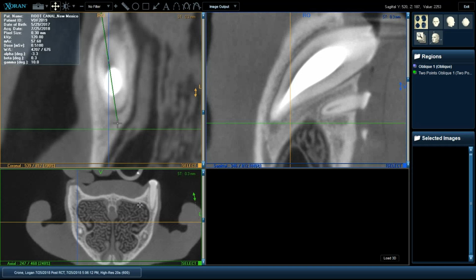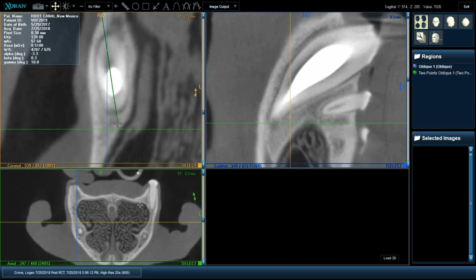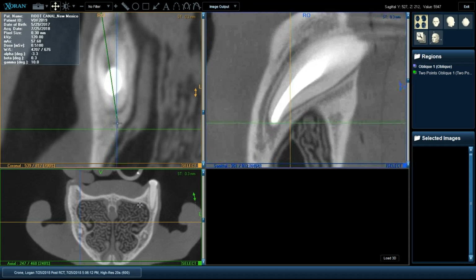This little dark lines around this very white dense area, that's normal. That's actually a specific artifact to CT scans. It's less significant on cone beam CT than it is on conventional computed tomography, but you'll see this little sort of dark shadow due to the X-ray system.